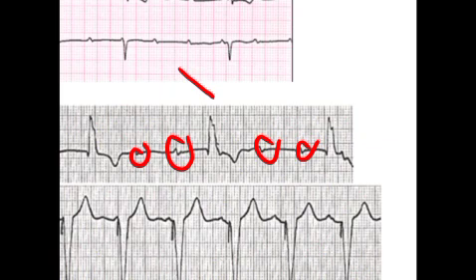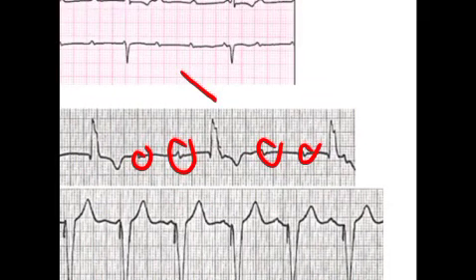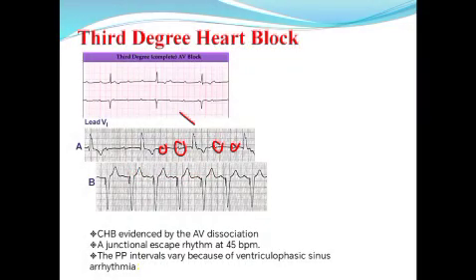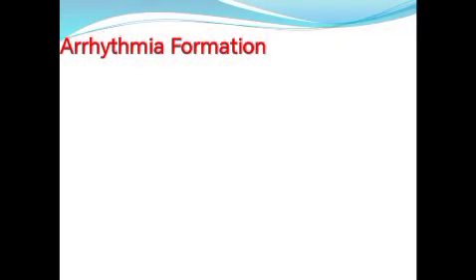Yeah, this is paced rhythm. You see, this is a spike. This is a pacemaker spike. The last ECG here is a paced rhythm. This is how complete heart block is treated, by putting in an artificial pacemaker to treat the heart rate, and this is why a spike appears here. This is a paced rhythm. We call it paced.